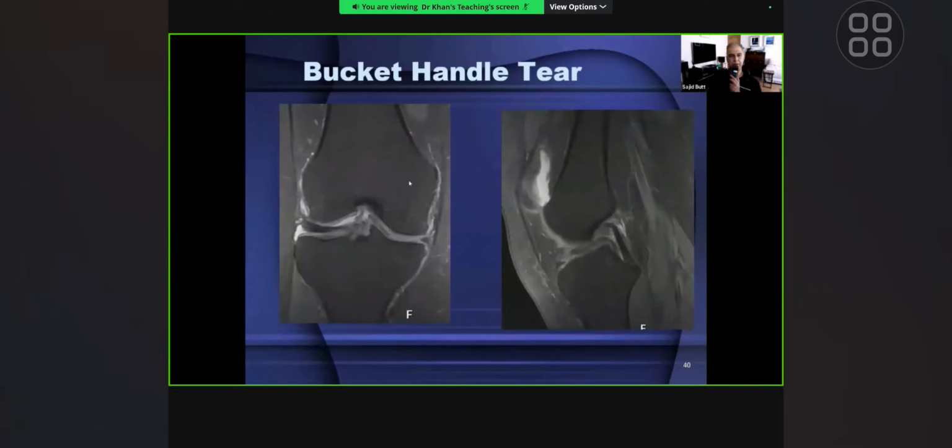Here's an example, coronal and sagittal imaging of the right knee joint. That's the lateral side. We can see that the anterior horn of the lateral meniscus can be seen here. The medial meniscus is quite attenuated. Compare the body size of the anterior horn of the lateral meniscus with the body of the medial meniscus. And there is some low signal intensity tissue present in the intercondylar notch.